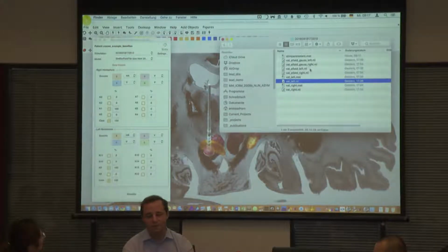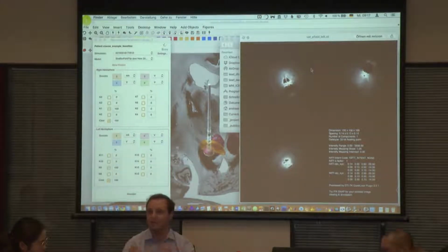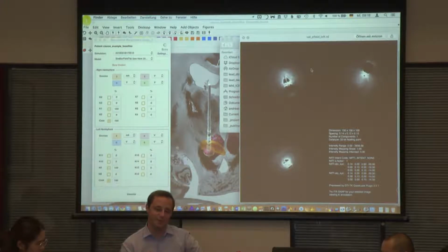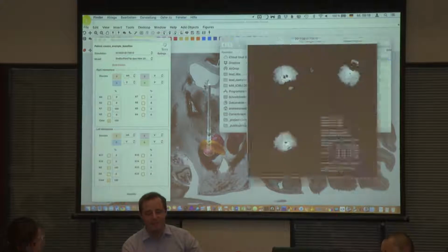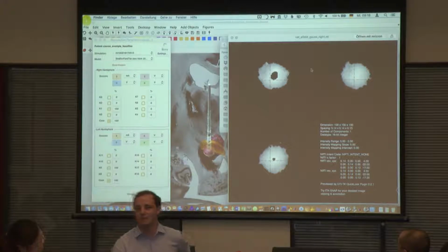There are some more files, so we have copies of the VTA, basically, which are called E-field. These are not binarized VTAs, right? These are the E-fields as the FEM algorithm calculated it, and E-field means the distribution of voltage in space, right? So if we have a gradient of voltage that is strong, then there will be a strong white pixel here, right? So these are basically the unthresholded VTAs. Then we have also copies of these which are Gaussianized, so they can be used maybe for some other statistical methods or so.